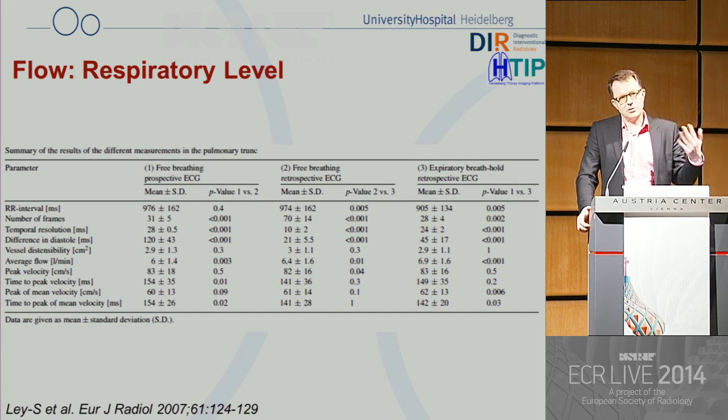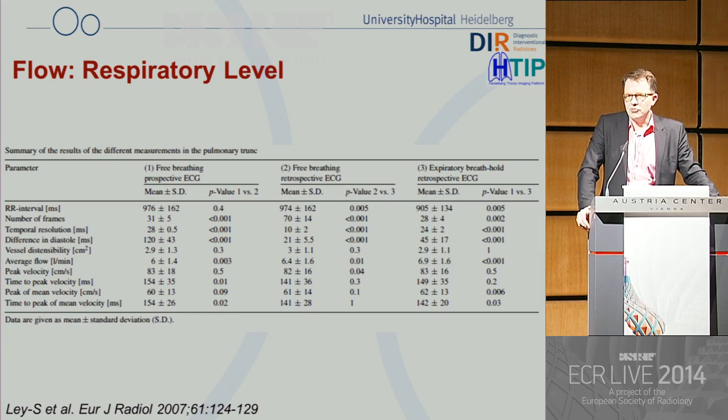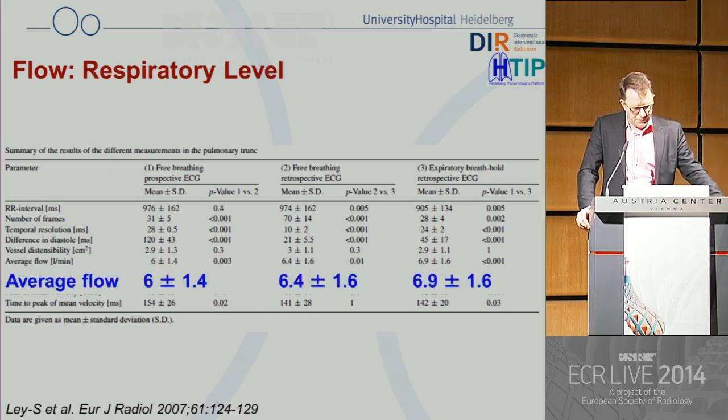But when you perform such measurements in free breathing, actually it will probably most reasonably represent the physiologic condition of our patients, or of us as humans anyway. So here are the flow measurements, and you see that expiration has a significant effect.